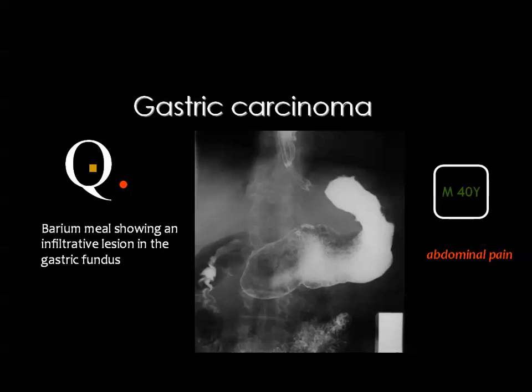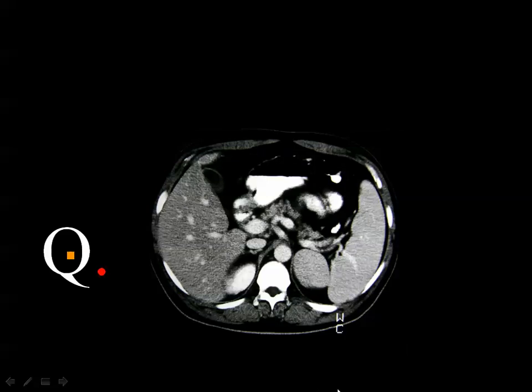In the proximal part of the stomach, or in the distal part of the stomach, or the whole stomach? Yes, you see that the distal part of the stomach is regularly distensible and the mucosal pattern is good, but the region of the fundus and the proximal part of the body are markedly reduced in caliber and in the lumen, with irregularity of the wall. Then you consider malignancy. And what is the suspected type of malignancy? Here it is carcinoma of the stomach. And the carcinoma is more distal than lymphoma, but a carcinoma can occur proximally also in the stomach. And both lymphoma and carcinoma can reduce the gastric lumen, either focal or diffuse.